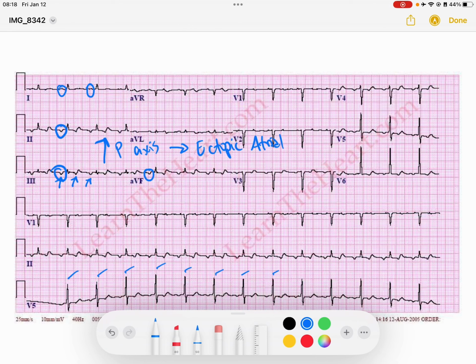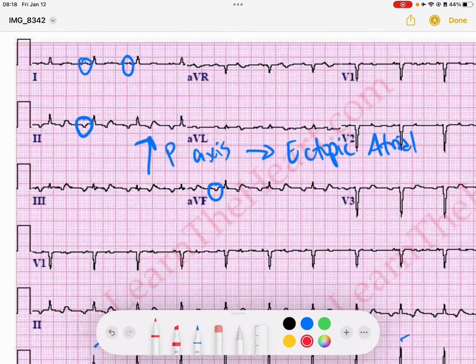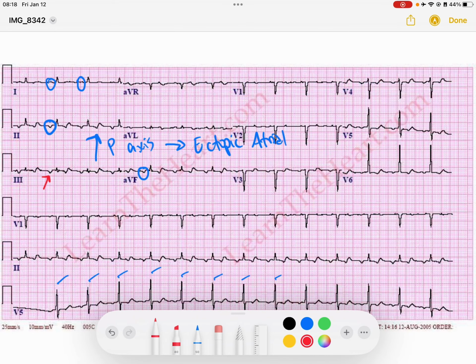But something interesting that I notice is my T waves, which are typically supposed to be broad and slopey. In this case, I have my P here, I have my QRS, and then the next thing should be the T, but I've got another sharp, jaggedy P wave that occurs in the middle of that T wave. And if you look closely down here in the lead 2 rhythm strip, you can see I've got P's that are marching through.